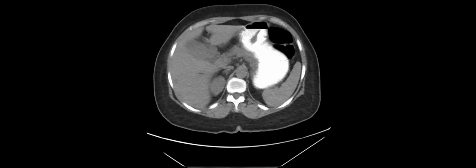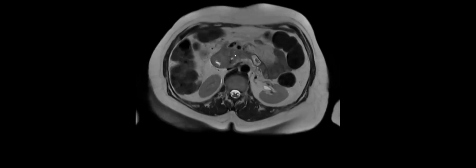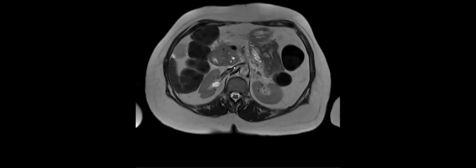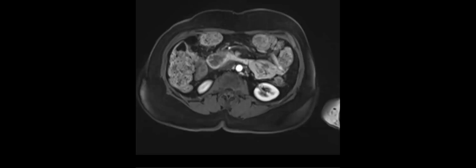Okay, wait for it. This is the MR. There is actually, this whole thing is a mass. And it's actually a pancreatic adeno that's arising very low down from the uncinate, and it's thickening and eventually it obstructed the duodenum as well. But you can see how you can see everything so much more nicely on the MR, right? And I'll show you a couple of other phases. This was the arterial phase, where that was the main thing. But there was still actually some spread of tumor over here. And then this is the diffusion. Look how big it is.